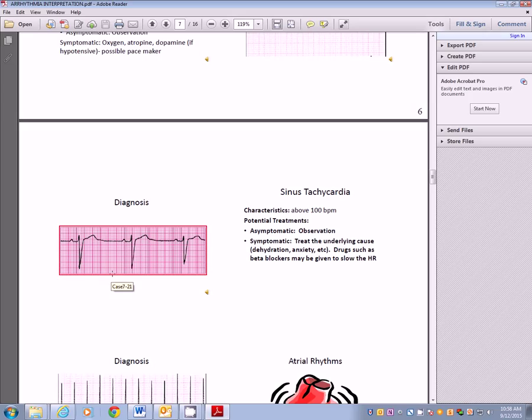The calipers, again, you would walk off, what we call walk off. This would be about right for that, so that if you were to take that and flip it, see it walks off. If you were to take your P wave to P wave, then it would just about walk off. That means walking when you can flip it and then it continues on to the same thing. Again, paper does the very same thing if you mark the paper. So you do not have to have the calipers. They're just nice. All right, so this is a normal sinus brady with a heart rate of about 30. Okay. Sinus tachycardia is another rhythm that you're going to see.